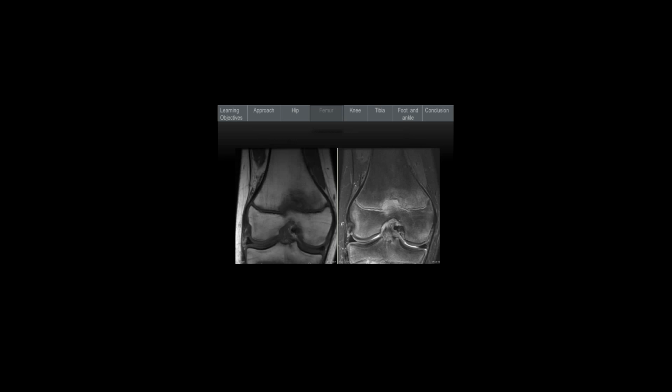In the distal femur, here's a child who is 13 years old, had left-sided knee pain. And you can see on the radiograph that there's an abnormality of some irregular lucency centered at the distal metaphysis right up against the physis laterally. This 13-year-old boy with left-sided knee pain was thought to have osteomyelitis. At some point, we did an MRI, and you can see the findings are abnormal also on the T1 weighted imaging and the T2 weighted imaging as well. But this child didn't have osteomyelitis.